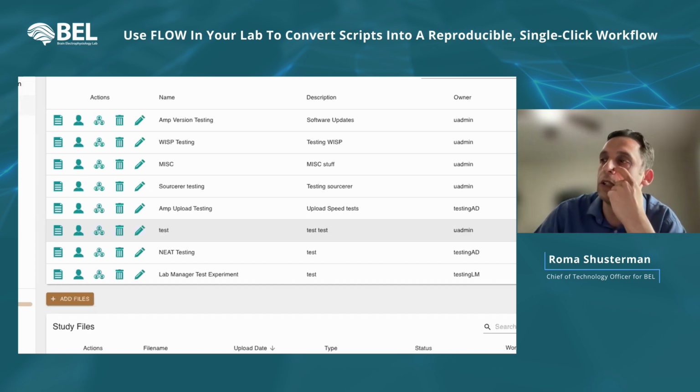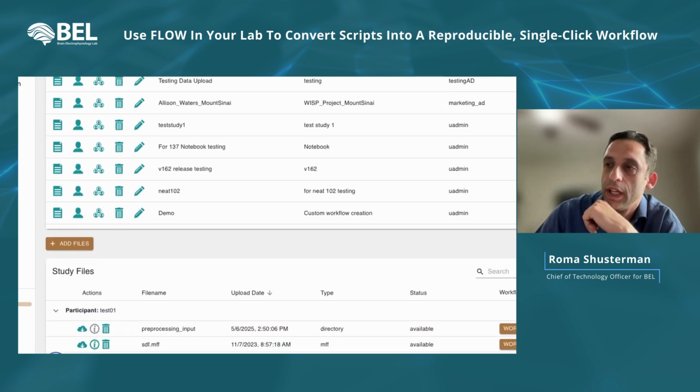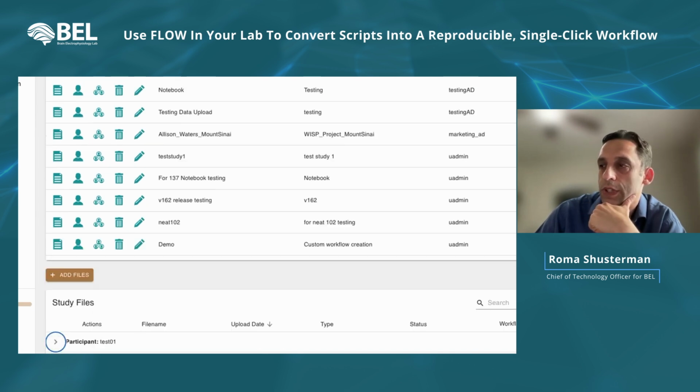So, not to wait for this, before the seminar we executed the same workflow on a different participant, and we can show here that this workflow generated this APICE output directory with all these output parameters that the user can download.